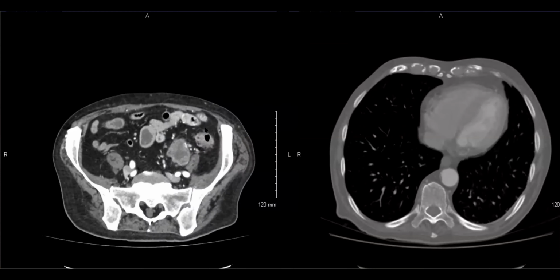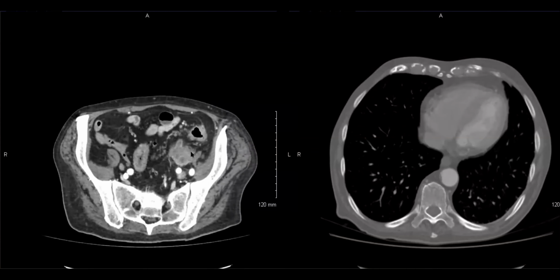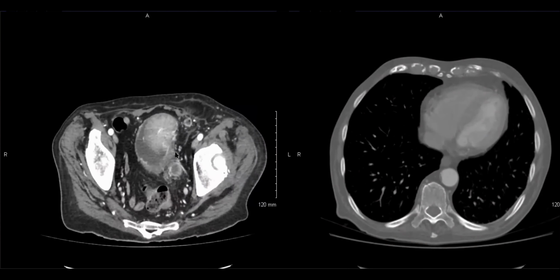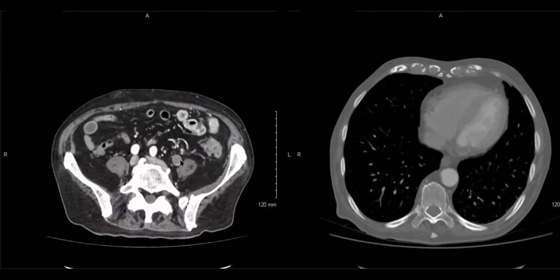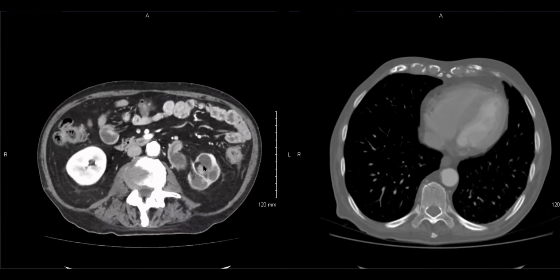Okay, there you go. So, patient, I've had some sort of cancer. I forget what it was. Oh, your TCC. This was just a tremendous TCC. In and of itself, this is an insane case because look at the amount of TCC. A lot of urothelial cancer there.